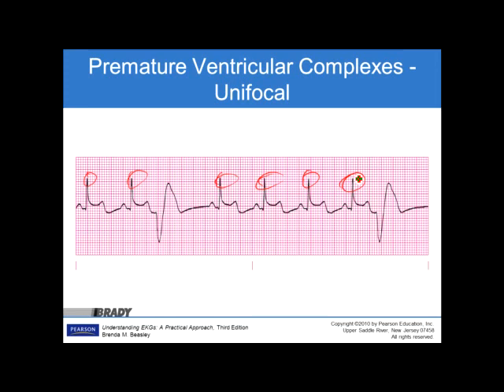However, when treating a patient that is having PVCs, the underlying rate is really, since all of these are regular and about the same spaces in between the R-to-R intervals, 300, 150, 100, the rate is greater than 75 beats per minute.